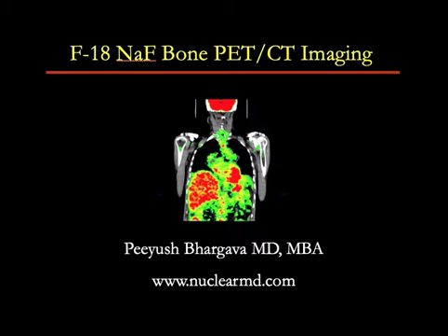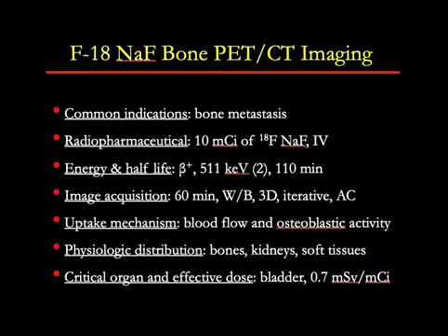Let's quickly review the protocol that we use to do this study. The indication being evaluate patients who are suspected of having bone metastases or patients who already have bone metastases and are undergoing treatment to follow up the status of their bone metastases. The radiopharmaceutical is 10 millicuries of F18 sodium fluoride, which is injected IV, and 60 minutes later, whole body images are acquired from top of the head to the tips of the toes in a 3D mode, and iterative reconstruction algorithms are used to process the data, and the CT, which is acquired as a low dose CT for anatomical localization and attenuation correction, is used as well.